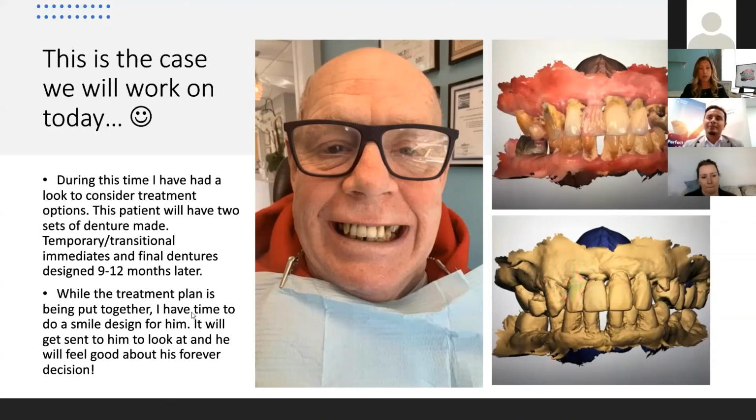So I'm always good about telling patients that this is going to look a little cartoony. This is a virtual mock-up. This is what I'm thinking. Maybe you're showing too much tooth. Maybe you want to correct the center line. So I can convey that to them during this time.